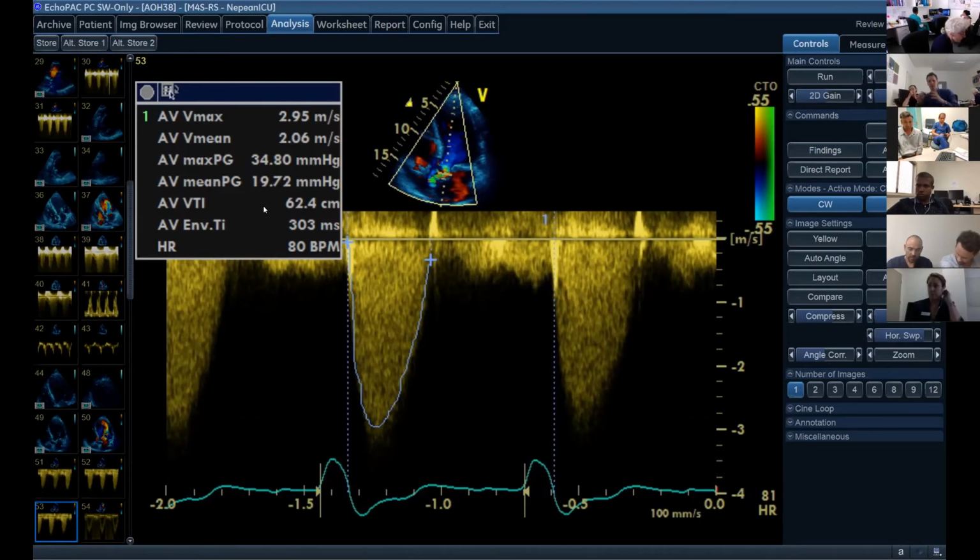Let's go through it a little bit. You've got to make sure you've got the LVOT diameter, square it, and then multiply by 0.785. Sorry, the LVOT radius. So do 0.785 times LVOT diameter squared, or you could do pi r squared, with the radius being half the diameter, squared. So you take the LVOT diameter or radius, and whatever calculation you want to do with pi is to get the area.